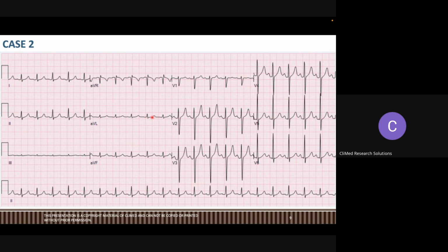If there is no P wave, that will be a straight line, like flutter, a complete flat line. Right? Everywhere it will be a flat line. Check here, P wave. I'm so sorry, I'm confusing P wave and P value, because I just took the statistics class. Okay, so see, everywhere it is P wave. Straightforward line. There is a similar QRS complex, no inconsistency at all. This is just a person who came out of the gym with exercise and with tachycardia.